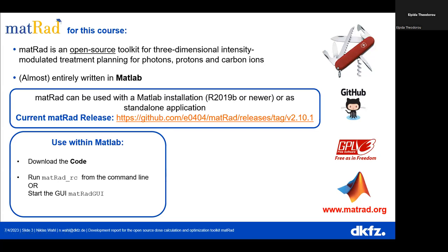And then there are two ways, probably for the minority of you. You can just download the code, not the installers, but the code, and then run these commands. Especially this command will give you the user interface later. If you run it like this, if you have MATLAB, you have the advantage that you can also look a little bit at what's going on behind the scenes, but that's not important for tomorrow.